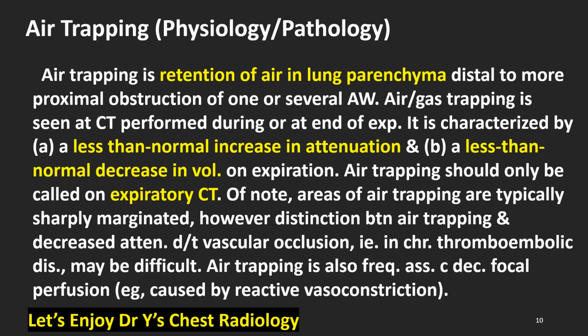Of note, areas of air trapping are typically sharply marginated. However, the distinction between air trapping and decreased attenuation due to vascular occlusion, in other words, in chronic thromboembolic disease, may be difficult. Air trapping is also frequently associated with decreased focal perfusion, in other words, caused by reactive vasoconstriction.